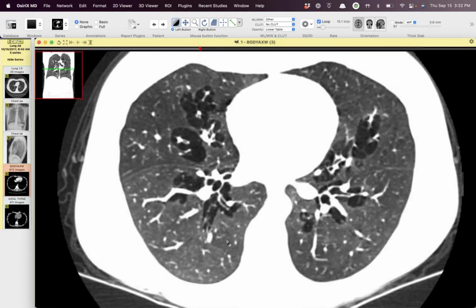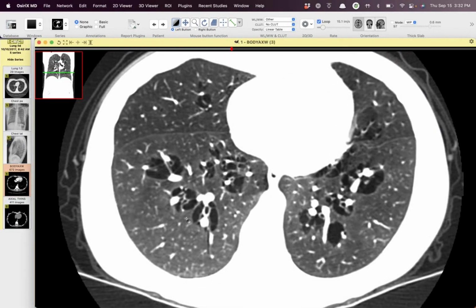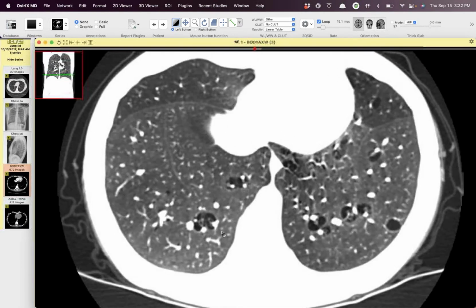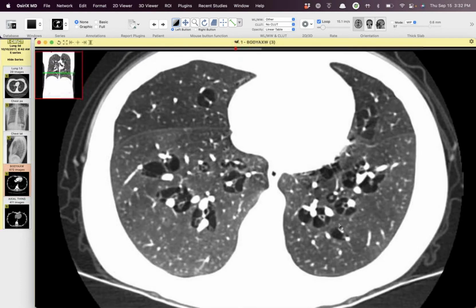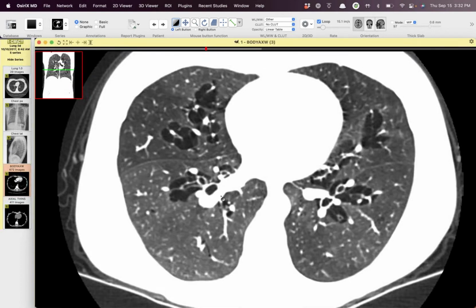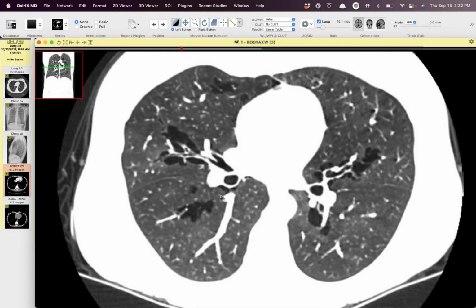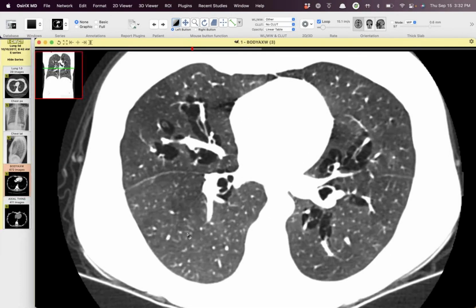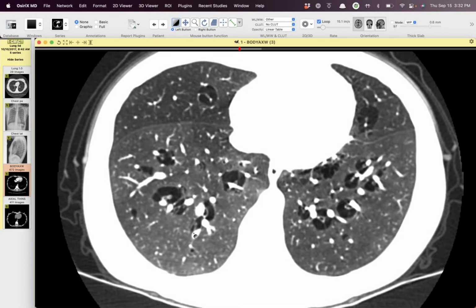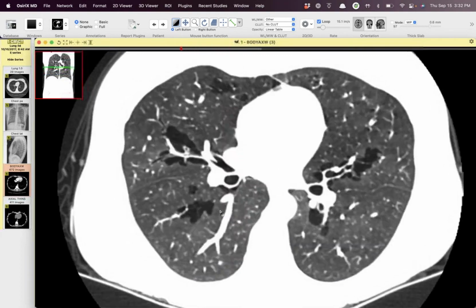And this is a woman in her 40s who's profoundly dyspneic and is actually being considered for lung transplant because her symptoms aren't improving, but just radiating out along all of the bronchovascular bundles, you get these areas of what looks like emphysema, adjacent to the airways. And I can't remember, David, if you or Howard showed something that looked kind of like this and ended up being amyloid. That was the one thing I thought maybe. There's some other clinical history I can give you guys in a minute. I'm just curious if anybody has seen this look before.